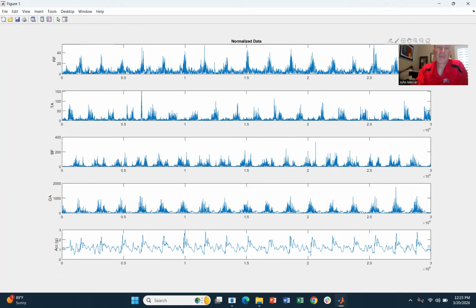So when I see this plot, one of the things I'm looking for are some nice bursts of EMG and some quiet periods of EMG. So this is rectus femoris. And clearly, rectus femoris is going to be active right after foot contact. And that's going to correspond to an acceleration peak down here. The rectus femoris can also be active right before contact, too, because you're preparing the muscle for ground contact. And so you'll see later on that that peak of activity doesn't necessarily occur at contact.